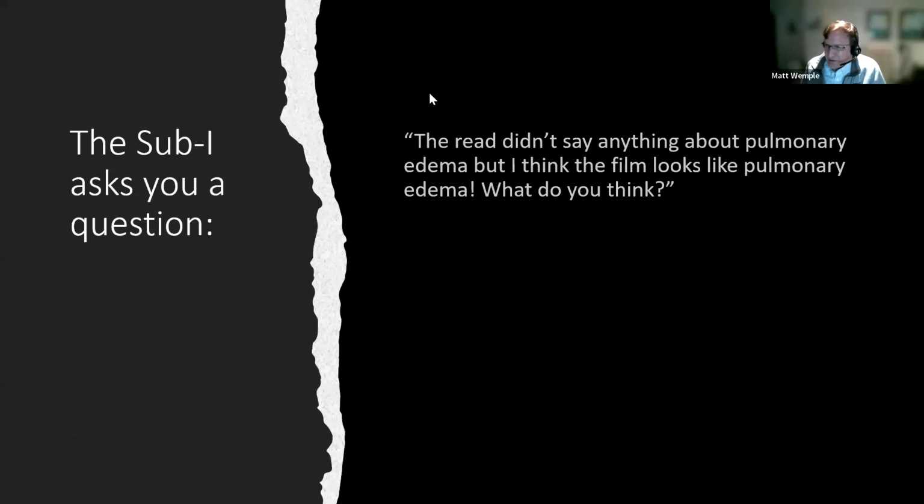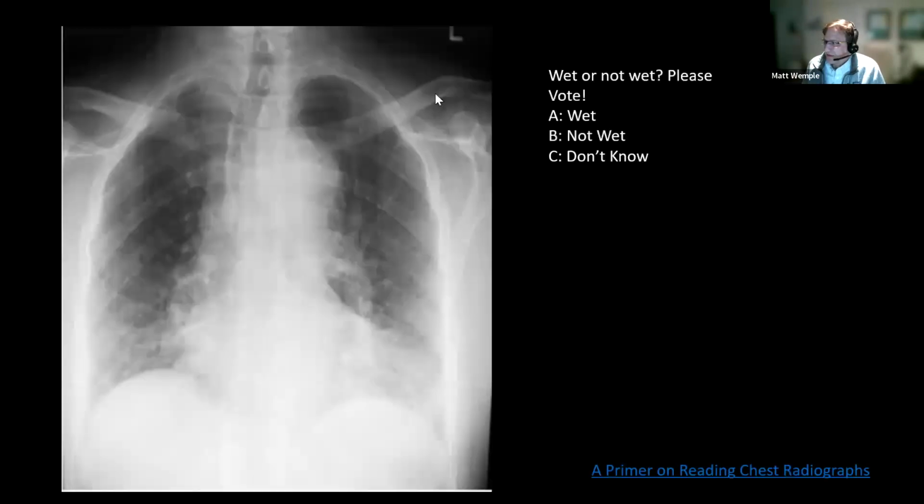So anyways, I'll ask you a question. You're sitting there. The read doesn't say anything about pulmonary edema, but I think the film looks like pulmonary edema. What do you think? So this is the first poll. Is this wet or not wet? Please vote.